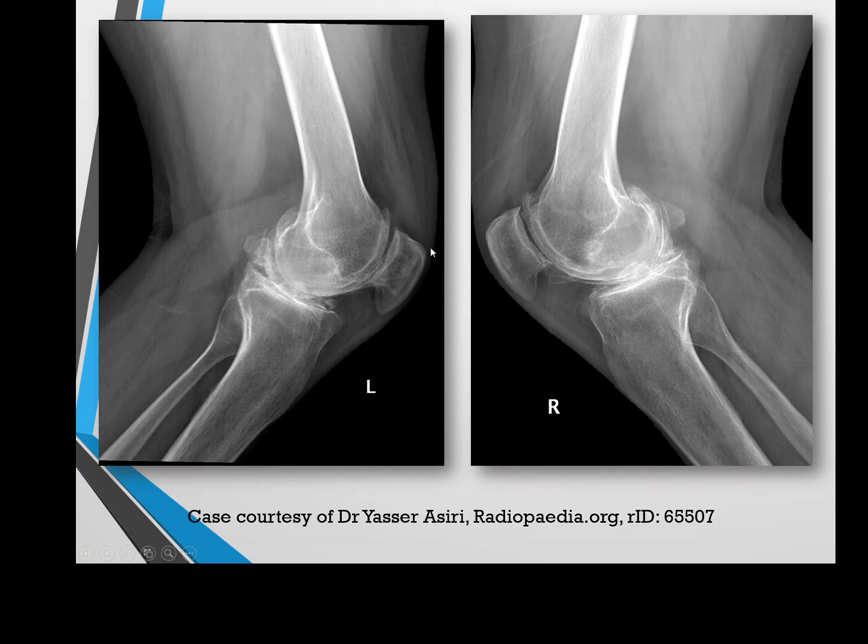and this is the same patient with the lateral projections of both the left and right knees. And again, at first glance, you could easily be mistaken for degenerative joint disease. We've got some loose bodies in here in the left knee. We've got quite significant degenerative changes occurring in the posterior aspect of the patella.